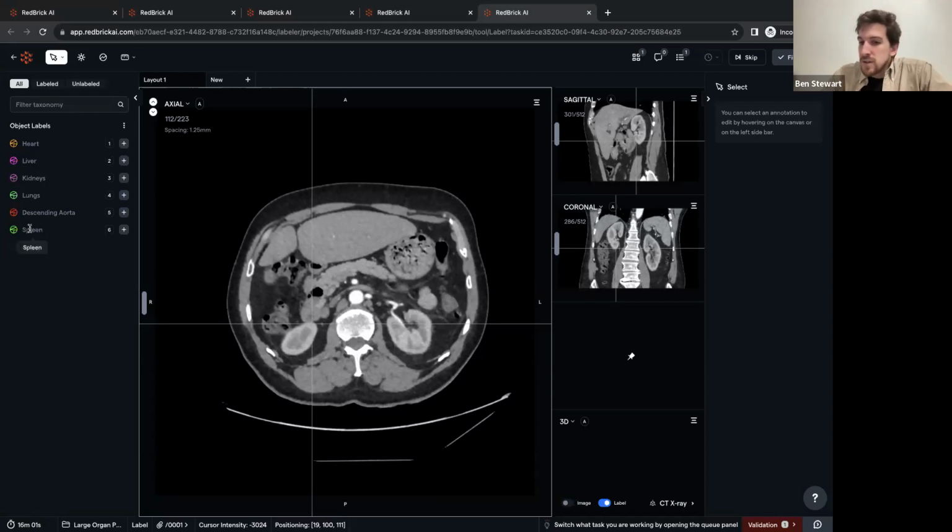These are all segmentations. And when it comes to segmenting and annotating, we know that a lot of users and a lot of clients are used to what I was showing with the brain BraTS study, right? You take a 2D brush and you annotate a structure, you go to another slice, you annotate it again, you go to the next slice and you annotate it again. That is possible. I'm not here to critique or judge.